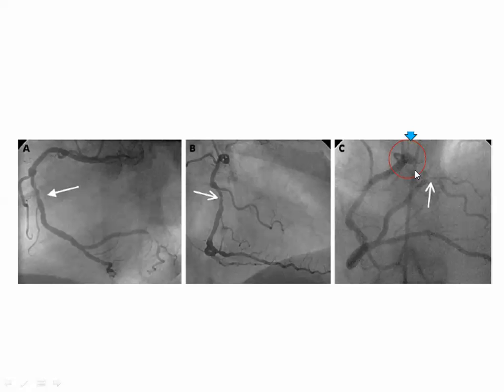This is the most anterior chamber. It's RV and the LV is small, okay? So it is the RAO, okay? It is resembling shallow RAO, okay? But you can't see the right atrium or LV, okay? If you come here, so it would be the RAO, okay? This is the AP, it resembles RAO. So anterior, apex, and inferior, okay? But with lesser degree. While the LAO, you will have a cut section, LAD and RV increasing. It's clear?